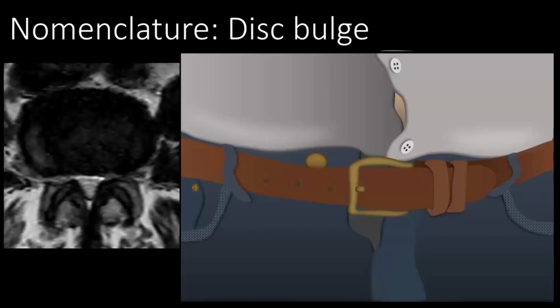Now, several things can happen to a degenerative disc. First, you can get a bulge. Now, I think of a bulge kind of like gaining weight. When you gain weight, you slowly get fatter and kind of loosen your belt. Or for us doctors, right, we loosen the ties on our scrubs. For a disc, it's kind of the same thing. The annulus degenerates, kind of like a loosening belt, and the disc gets a pot belly, just like we do. So you lose that renal hilum as the belly kind of squishes or expands outward with the loosening belt of the annulus.